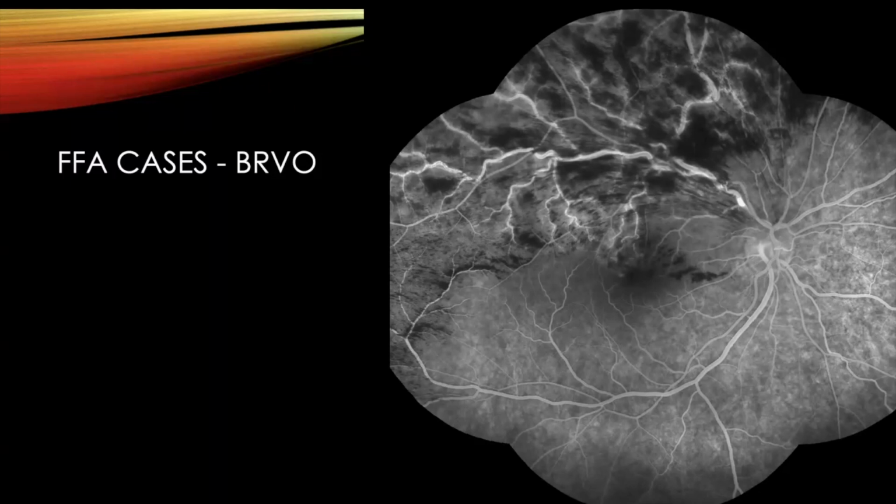But you can go and read up on some of the other findings that you'll see on an FFA. The point of this talk is just to show you some pictures of what things may look like when you come across them either in clinical practice or in your exams.